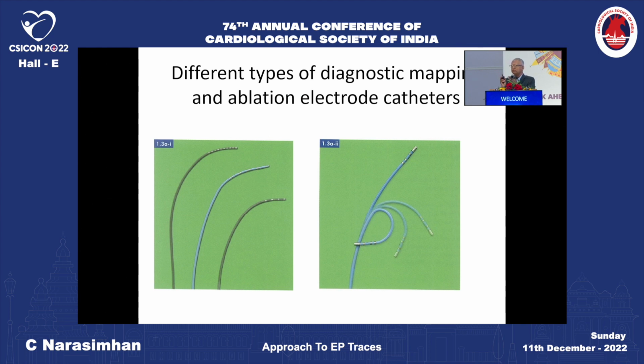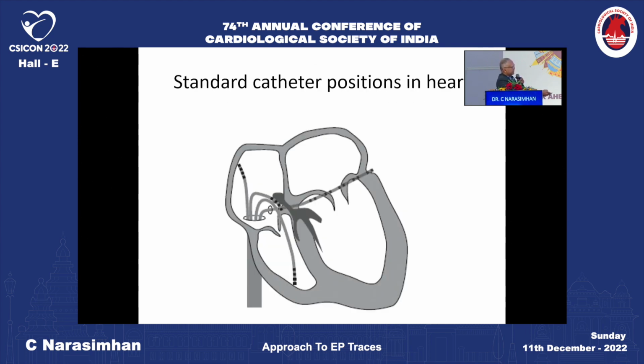Now, how do I do that? I change the frequency. Instead of 0.01 to 100, we make it 30 to 400 hertz. Then you ignore the T waves, you ignore the P wave, you ignore the diaphragmatic oscillation. All those are at different frequencies. You selectively look at the frequency of the electrical activity occurring under the myocyte.